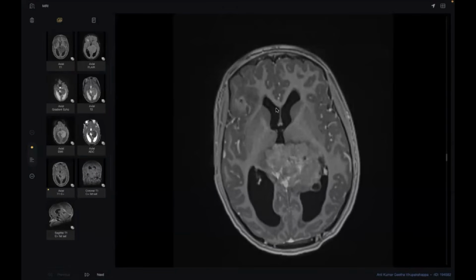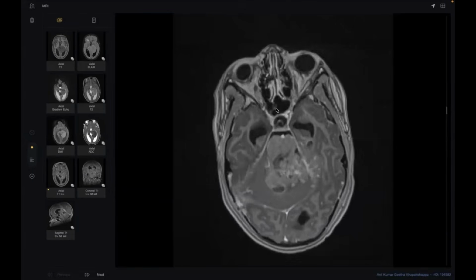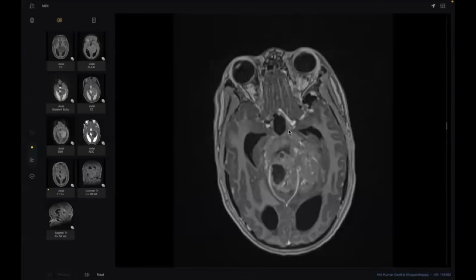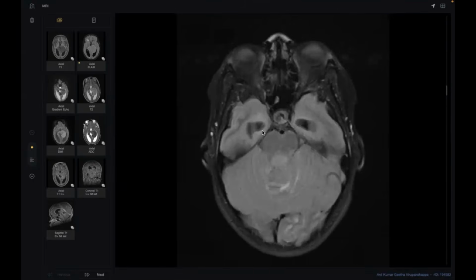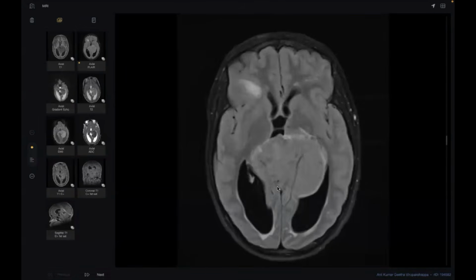In any lesions like this, in axial, it is very difficult really to know the exact site. I will give you very simple advice. Look at the brain stem and see, is this large lesion anterior or posterior? If it is anterior, like the case before, we are talking about something suprasellar. If it is posterior like this, we have a big doubt of a pineal origin.